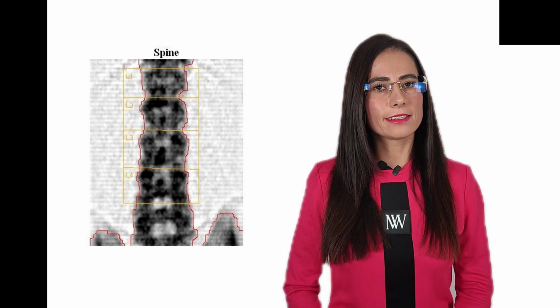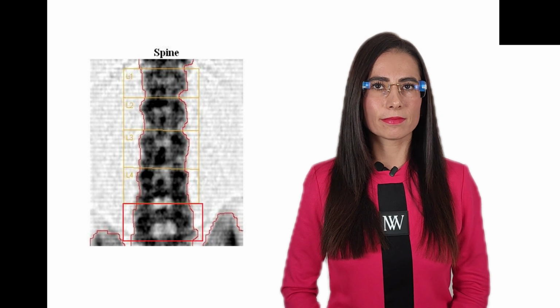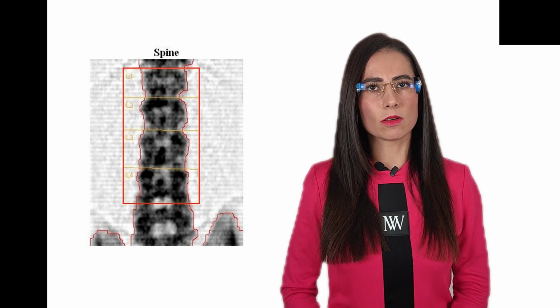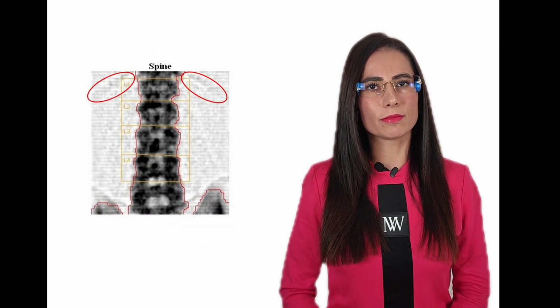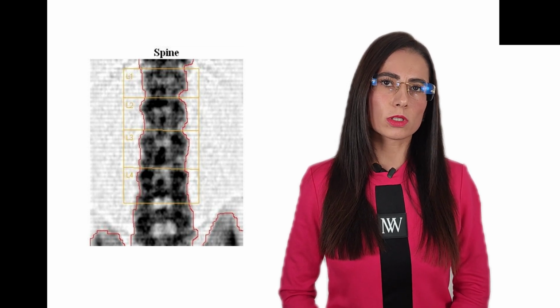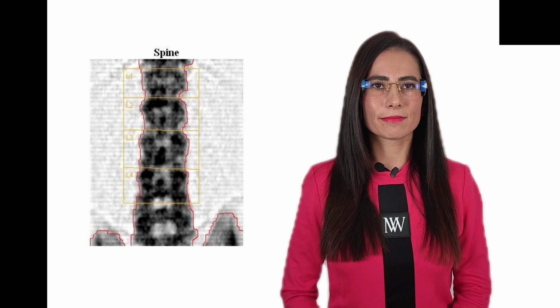How do you know if your scan is accurate? If your examination was done correctly, the image should show from bottom to top the crests of both iliac bones, half of the fifth lumbar vertebra, the remaining lumbar vertebrae, half of the 12th thoracic vertebra, and the last rib. The spine should not be tilted. Of course, in some cases, this is impossible, for example, in patients with severe scoliosis. In this case, the operator should adjust the region of interest.